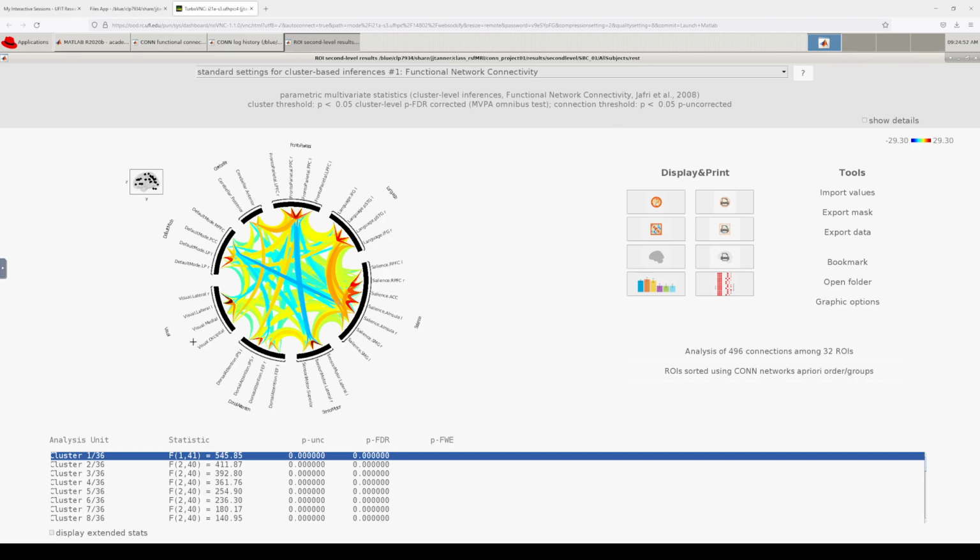You can use other atlases. This has built-in atlases. There are other ways to look at the brain and parcellate it, as it's called. And there's no one best approach. This is just what's the default. If you want to use different atlases, you can do that. There are ways to add those in and do the processing. And we will not cover that. But this will show connections using this graph network.